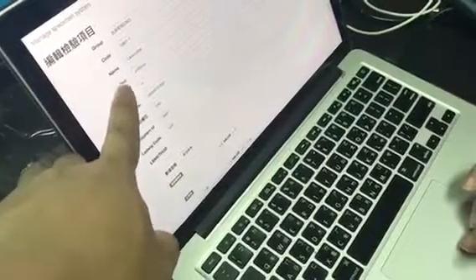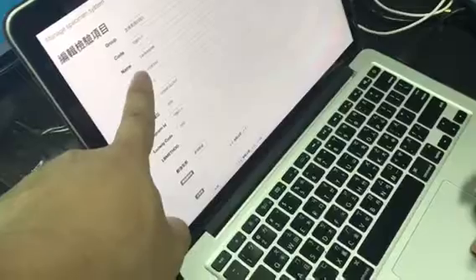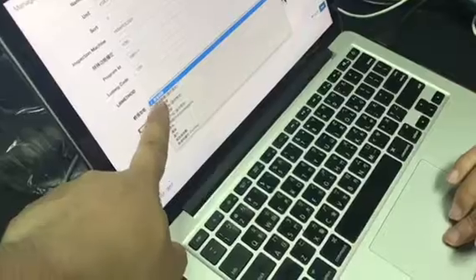So here is some basic profile for the testing. Like this one, leukocytes. Down here the machine is from hematology, and down here you can set up the type. Can we choose this one? Although it's Chinese, I will try to explain.